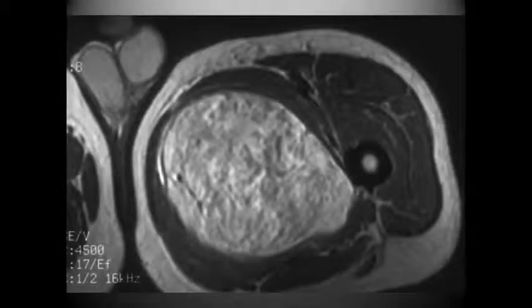Okay, here is a classic representation of a lipoma. We can see that this patient has probably considerable swelling in the proximal femur, and we can see all of the muscle groups here, and we see the femur in this area, but we see something that is kind of abnormal or strange, and it's this rounded density here.